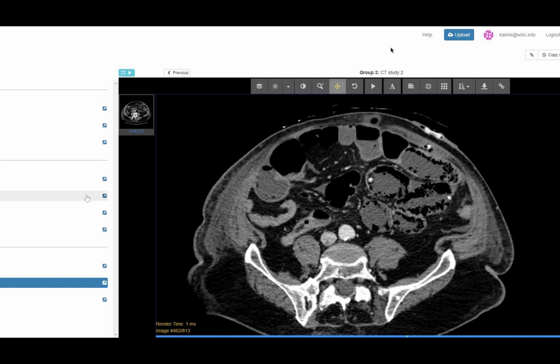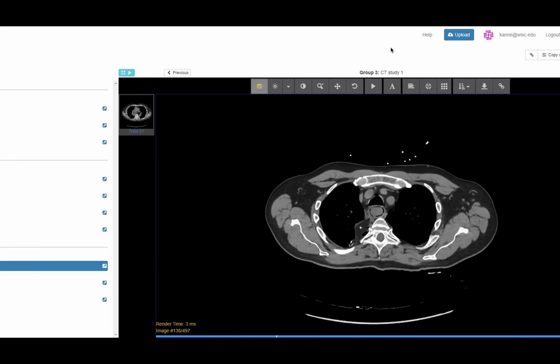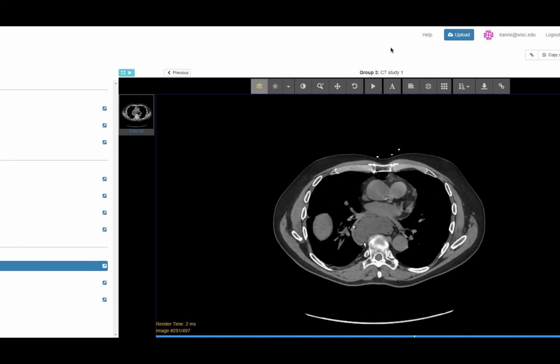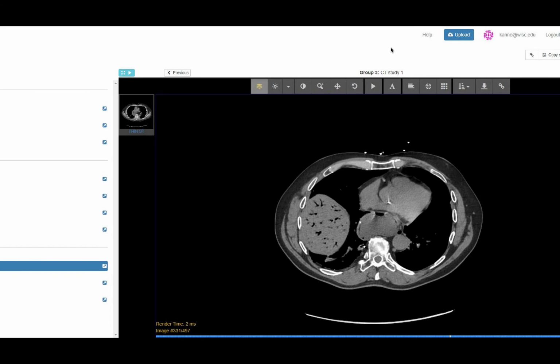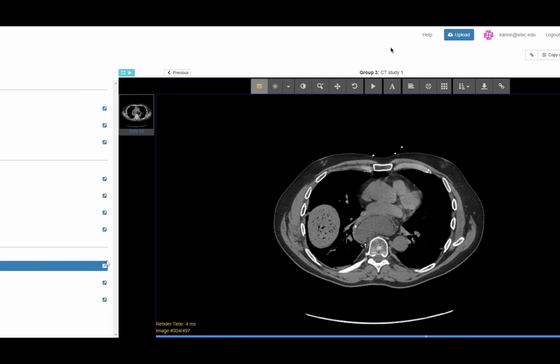Jeff, what is the conduit made from? It's stomach. Okay. Yeah, that's the typical one they would do, and occasionally they'll do small bowel or colon if the stomach is not usable. But yeah, they pull about 75% of the stomach into the chest. Because we've seen ischemic ones, and you'll see the staple line will fall apart, but not really pneumatosis.